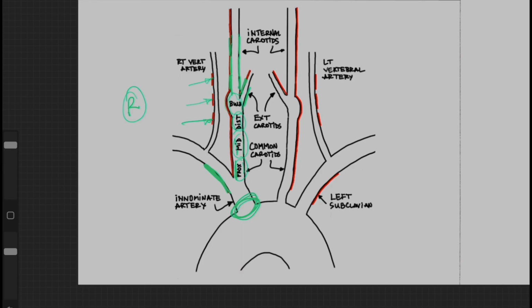They generally can't see the proximal innominate here, and this is where blockage happens, right where vessels come off of their origin. And so the test really can't directly see that blockage, typically. So after they do all that stuff on the right, then obviously they do the same thing on the left. So that's the sequence of the study.